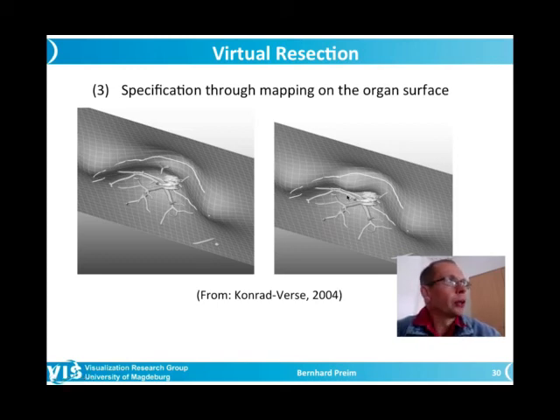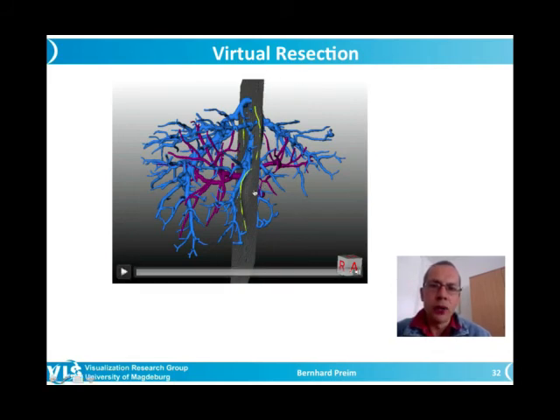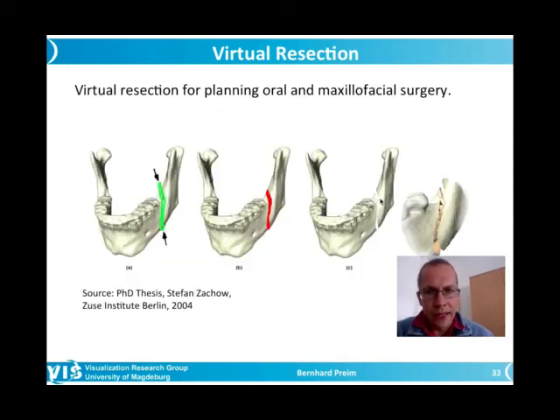The major motivation for the user to do this in our user study was in order to adapt where to cut in the vascular structures, whether certain branchings of a vascular structure should remain in the patient or should be part of the resected volume. Yeah. So this would be an example of such a clipping plane, and the user may draw here and change things. And as a consequence of the influence zone, the areas of the grid that are actually affected would be drawn in another color, to convey to the user what actually has changed.